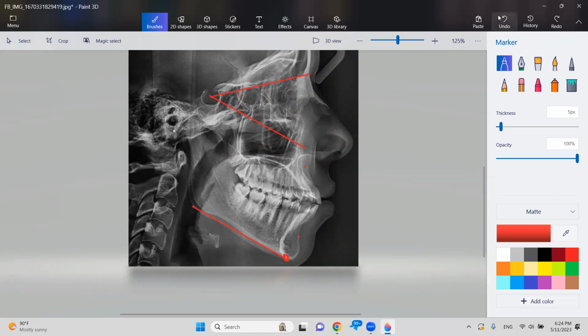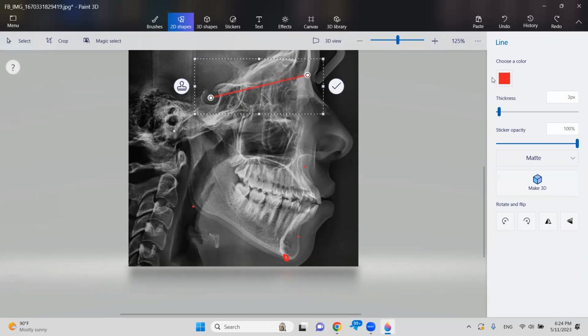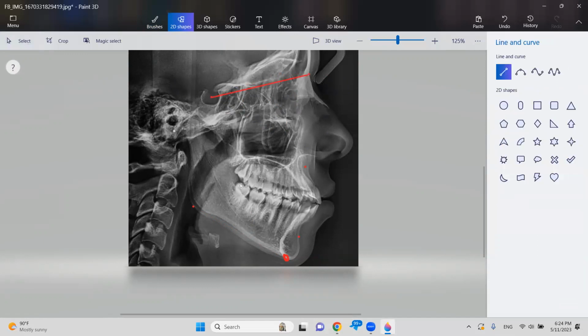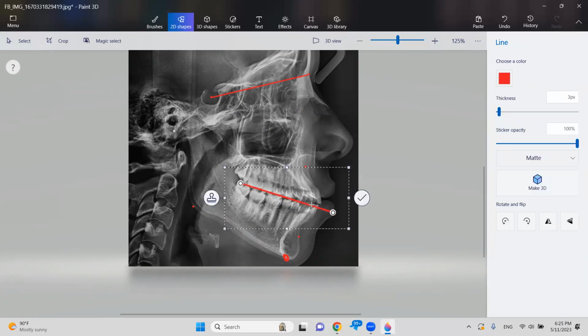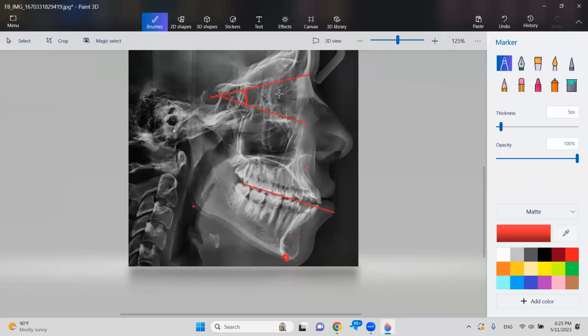After assessing the vertical skeleton and anterior posterior, next we assess the occlusal plane, and the same using SN line here, and draw the occlusal plane line. If we move it up to SN, this way, this angle should be 14 in normal cases.